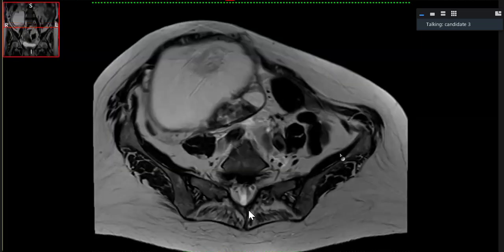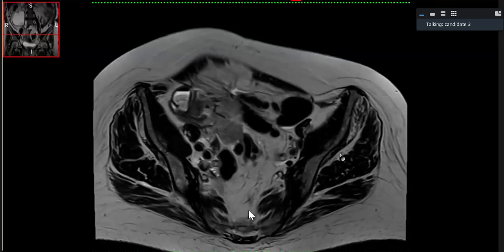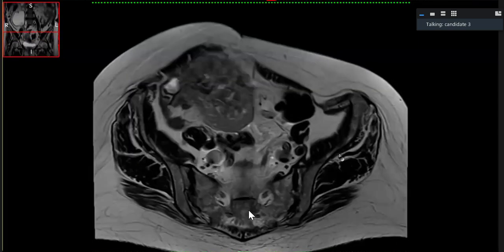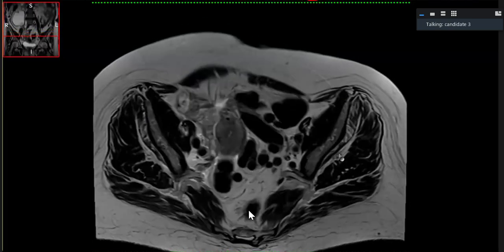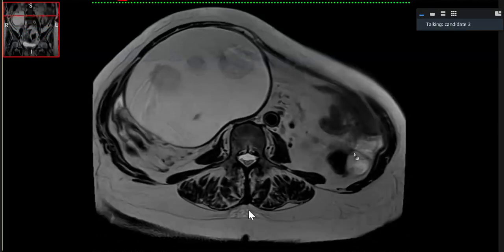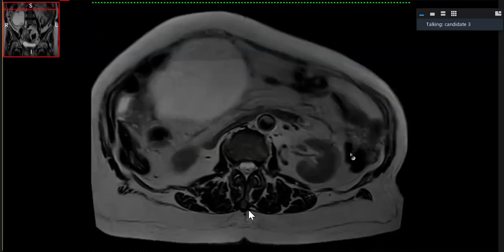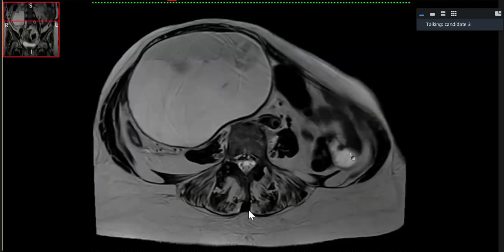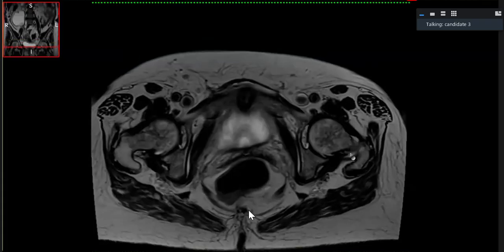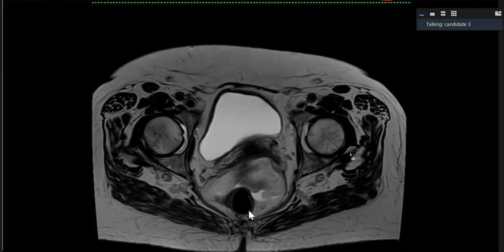Okay, so it's an old age patient with a large complex cystic cum solid mass lesion on right side in pelvis. I'm highly concerned about some aggressive pathology like neoplastic mass lesion. It is making close contact with adjacent bowel loops with loss of intervening planes, and there is some tethering here as well. However, there is no associated obstructive bowel dilatation. And looking at rest of abdomen, I can see a few prominent para-aortic lymph nodes, and there is some soft tissue nodularity in the pelvic region in peritoneal outline. In my routine practice, I will also have a look at post-contrast study and on T1 weighted images.